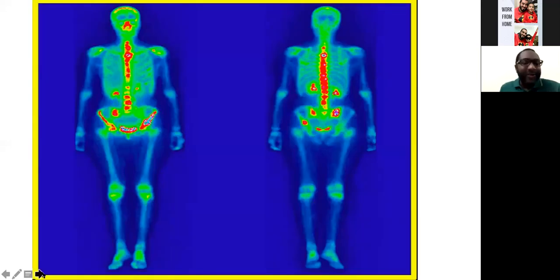Now, again, in nuclear medicine, we are very colorful, so we can use any color. So don't be confused or don't panic if somebody displays this kind of colors to you. There are various colors that we can use in nuclear medicine, and these colors do not change at all the interpretation or the pathology of the process. But what we have seen over the years is that depending on the type of examination that you do, there are certain colors that tend to accentuate lesions. So you can see lesions much clearer with other colors preferentially.